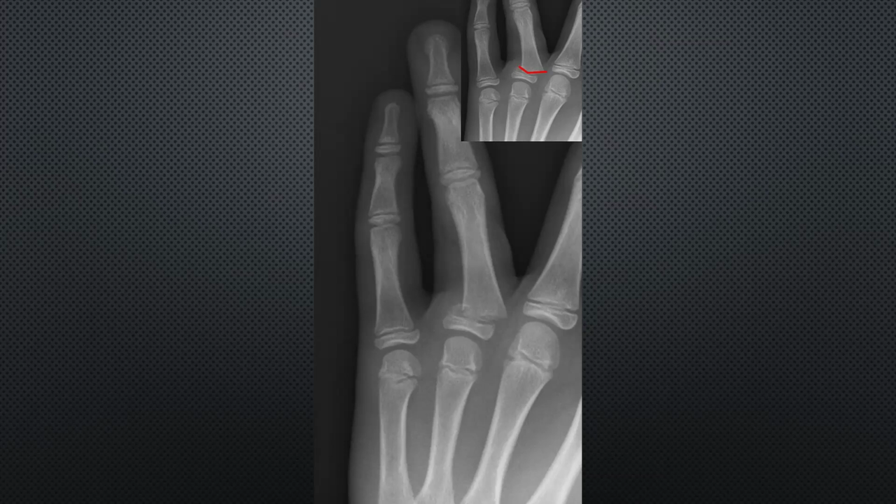Yes, sir. So this X-ray for the ring finger is easy, because you can see above and below, right and left. Is it accurate? Not accurate, but it is adequate. Adequate for the ring finger only. And any problem in alignment?